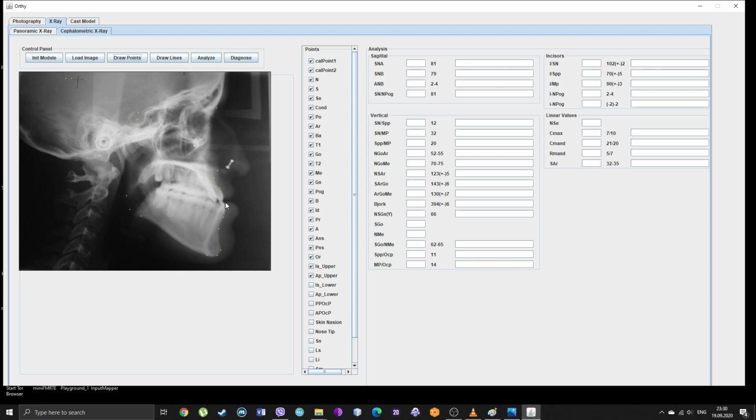It's for presentation purposes. Is lower. Okay. The posterior point. This is the mid, somewhere around here, and these are the irrelevant points I was telling you about. Maybe some other version of this program will use them, and this is totally irrelevant where I'm going to put it right now, but I'm going to put it somewhere around.